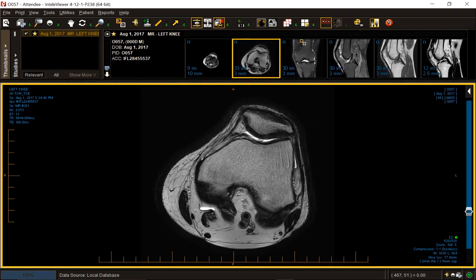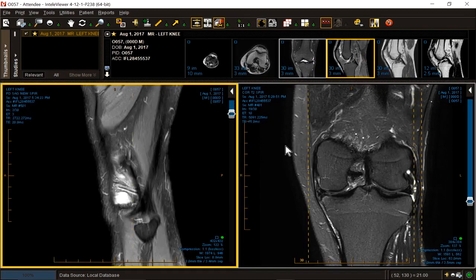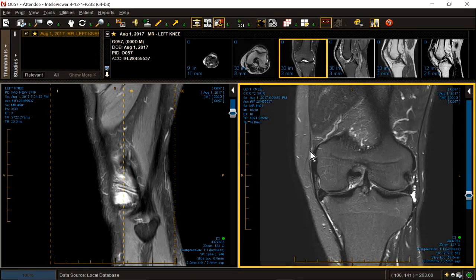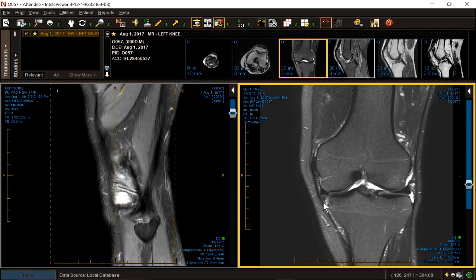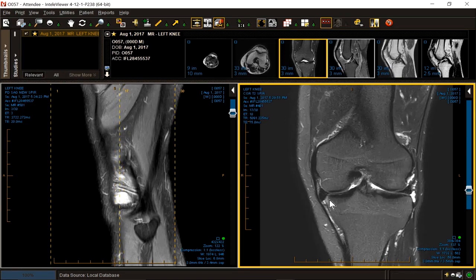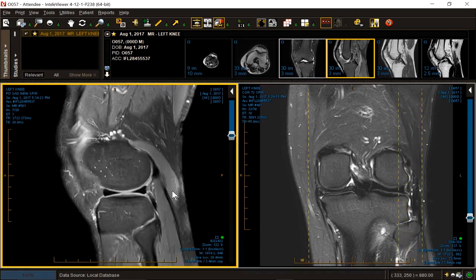Let's get to the water-weighted images. I'm not a big fan of T2 imaging for meniscal evaluation, but it does do a very good job at looking at menisco-ligamentous relationships and meniscal position. This meniscus is extruded into the gutter. It's in the paratibial gutter. Patient is not even standing. So this meniscus is essentially non-functional. Let's keep looking at it. This is the lateral meniscus, normal for age.